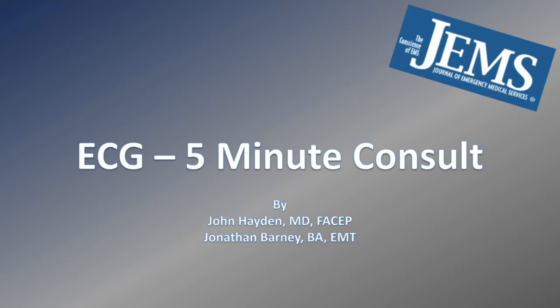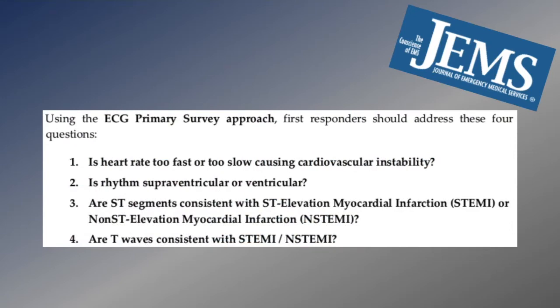For each ECG, we will be performing what we call a primary survey, in which we address 4 crucial questions in regards to interpretation. Is heart rate too fast or too slow, causing cardiovascular instability? Is rhythm supraventricular or ventricular? Are ST segments consistent with ST elevation myocardial infarction (STEMI) or non-ST elevation myocardial infarction (NSTEMI)? And are T waves consistent with STEMI or NSTEMI?